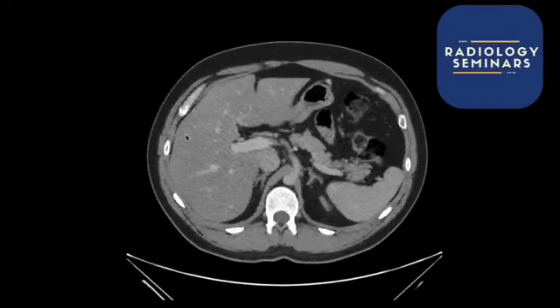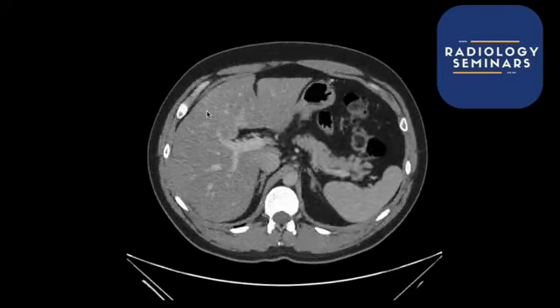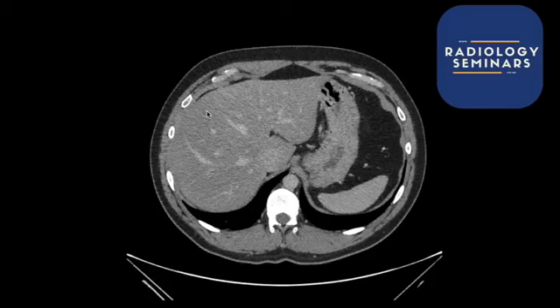So whatever's between 4 and 6 is going to be 5, okay? And when you come to the very top of the liver, the dome of the liver, you're going to be looking at sort of segment 7 and 8, okay? It does take a bit of a while, but maybe just use my landmarks, okay? 2, 3 is going to be the sort of triangular area here.